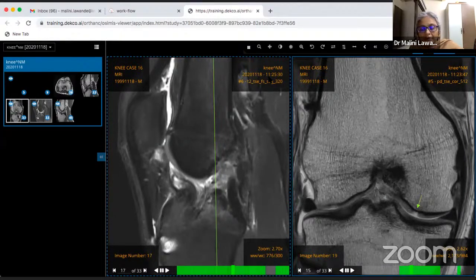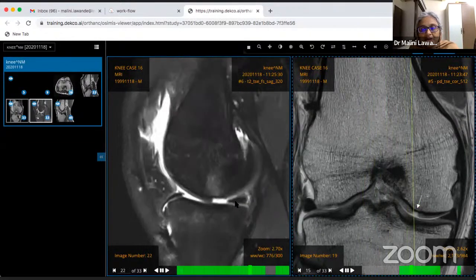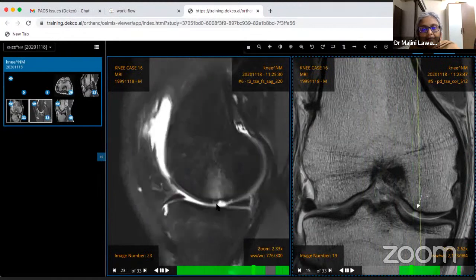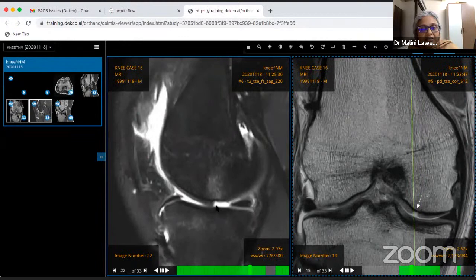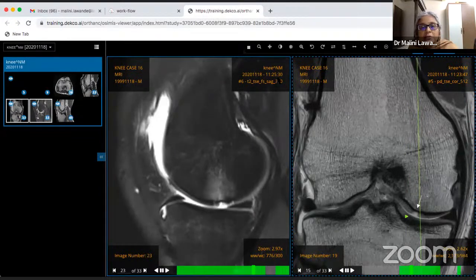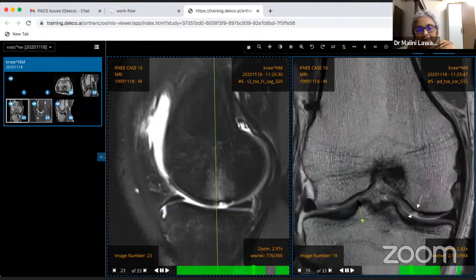So remember, we look at cartilage carefully, and the same section here. Yeah, you can see this cartilage out here. So whenever you have marrow edema, look at the overlying cartilage. Here there's a full thickness cartilage defect. And this looks like an acute cartilage defect because there's underlying marrow edema and it's very sharply marginated. The older chronic ones are usually wider and not so sharply marginated.